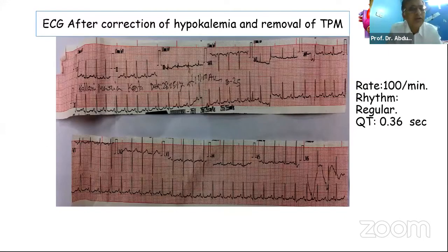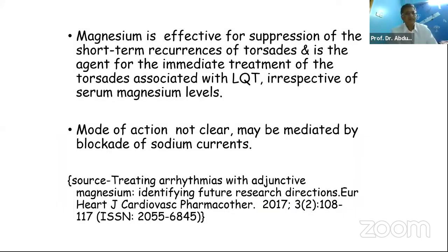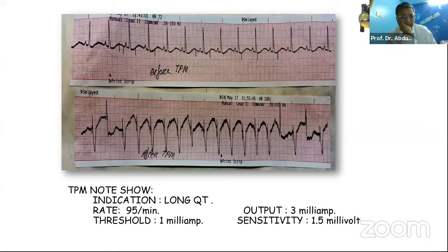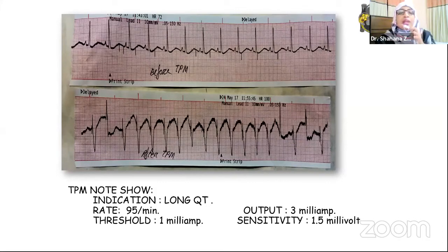Shahana, can you go back? After magnesium and potassium supplementation, what was the QT? QT prolonged after DC cardioversion, potassium, magnesium injectable.